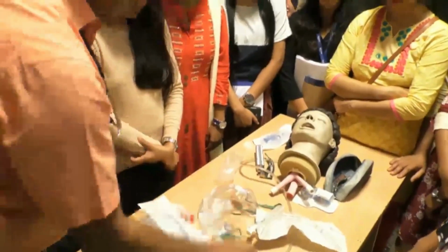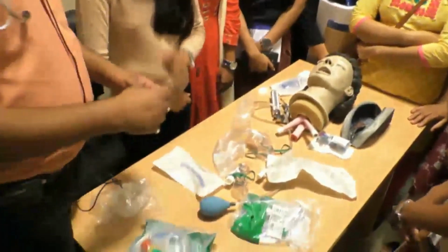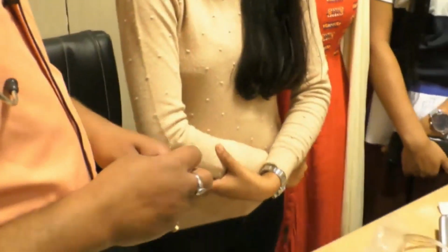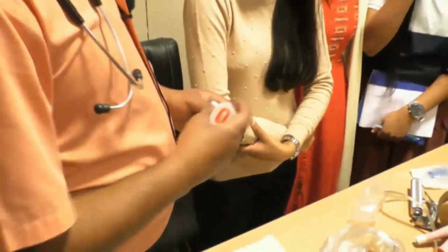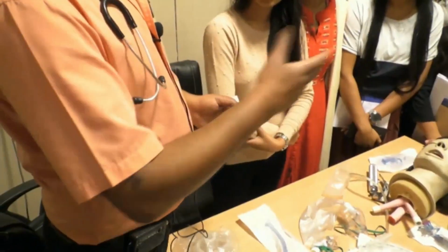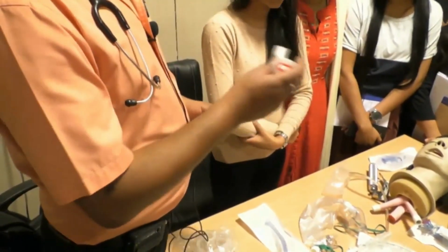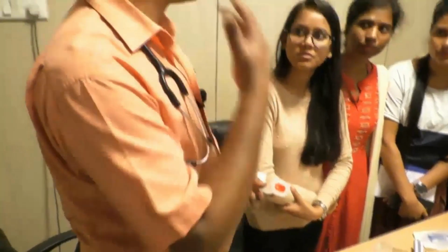So we are dealing with airway devices. चलो उठाओ एक. What is this? When do we use it? Whenever we are suspecting any upper airway obstruction, ठीक है? Like a few patients with poor GCS, drowsy patients, those kinds of patients, we often see some obstruction, some sound coming, suspecting tongue fall or any soft tissue obstruction. We use it in those patients.